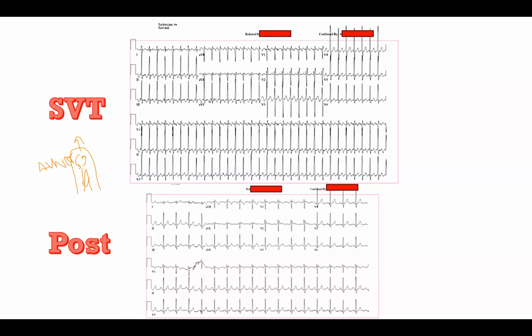And lead 2 was lousy, which is interesting because in many ICUs, lead 2 is the lead that is displayed pretty traditionally. But actually, it was lead 3, and I think in this example there is some evidence that the retrograde P waves can be seen a little bit better, but it's not a very obvious one.